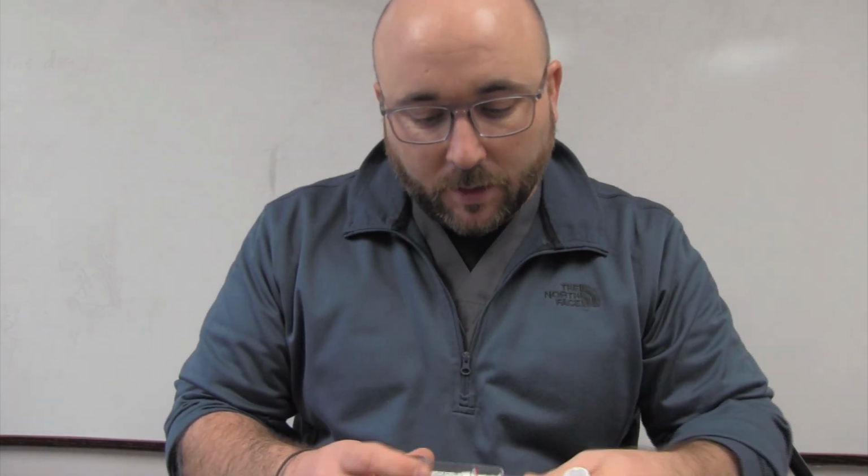Now, if patients have neuromuscular disease, Guillain-Barré, something like that, they want to train some muscles or test their muscles, they can do that also. So let's crank it all the way to the top. Let's see if I can do 40. We know that if you're going to extubate a patient, you're looking for a NIF or negative inspiratory force. Greater than 20 is our goal, which, when it comes to this, is not a lot. And when it comes to the vent, it's not a lot. But let's try negative 40. Let's see if I can actually break it over.